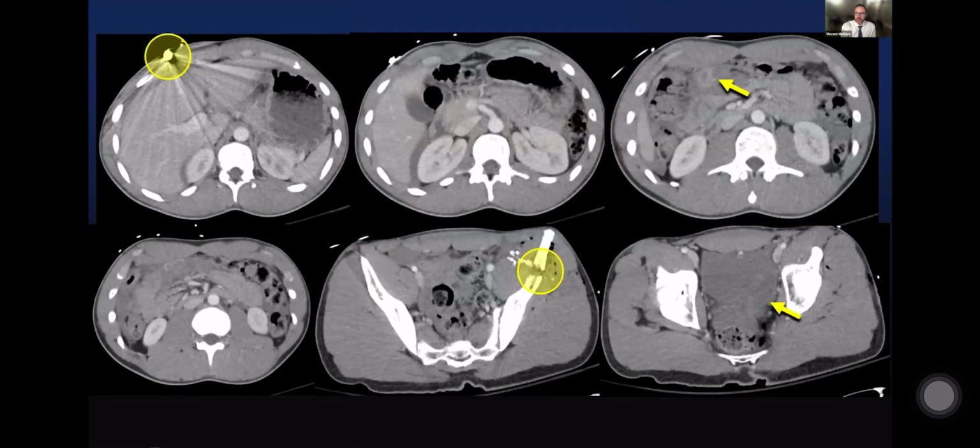In contrast, this patient clearly must have a bowel injury. They have a gunshot wound that went through the left iliac wing. The bullet landed in the right upper quadrant. There's hemoperitoneum. And if you trace a line between these 2 points in space, there's an awful lot of small bowel in the way. In this case, clearly thickened adjacent mesenteric blood. And just on the basis of the trajectory of this injury, we should be worried about small bowel injury.